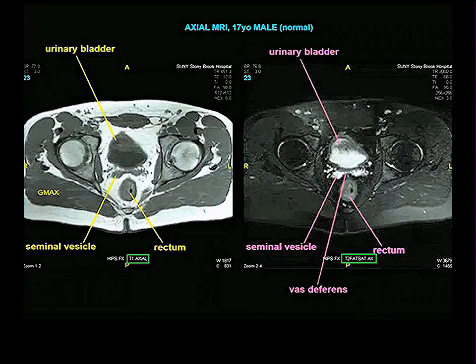Regular T1, T2, fat saturated, urinary bladder, urine and urinary bladder. Look at the seminal vesicles light up in a T2. I don't know why, but they do. I mean, they have fluid in there, some of the fluid that will become part of your semen. But I would have thought it would have been highly proteinaceous. But they do. They light up.